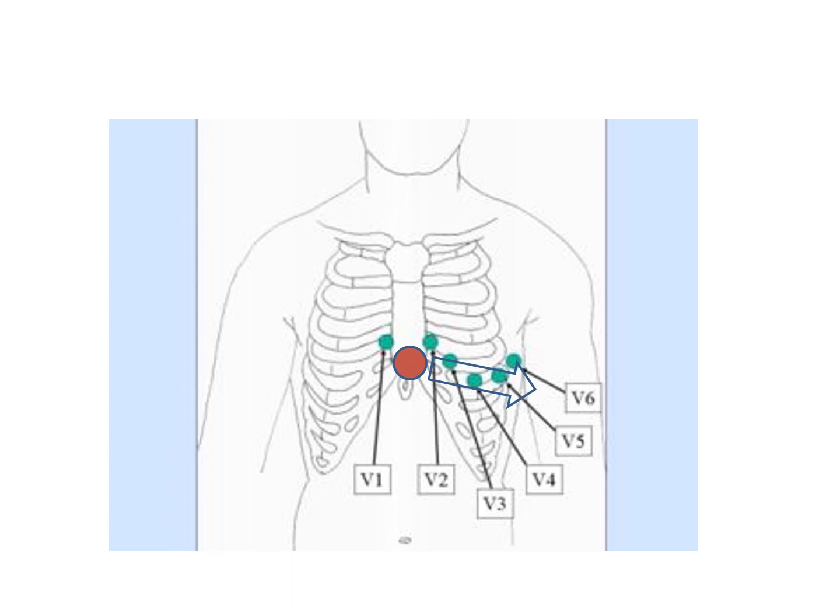So that means that the majority of the time, the precordial leads which will have strong positive deflections are going to be those that look down, left, and towards the apex and away from the chest wall. So those will be leads V4, V5, and V6. And the other leads will be more negative, especially lead V1, which completely looks in the opposite direction of where the electricity is going.